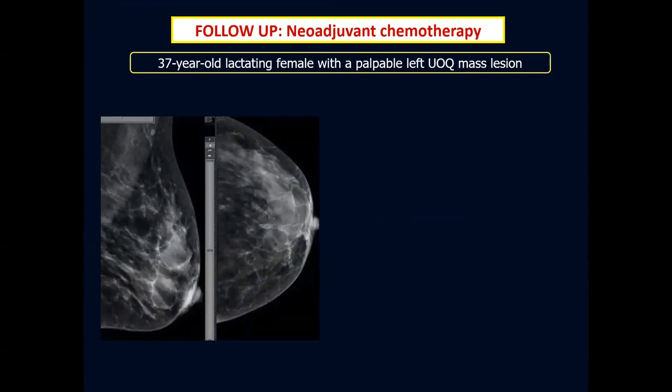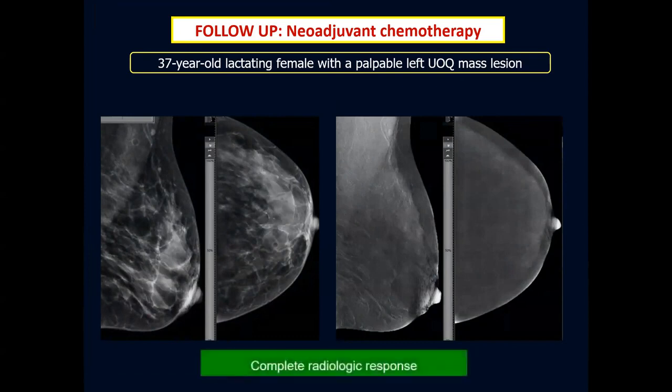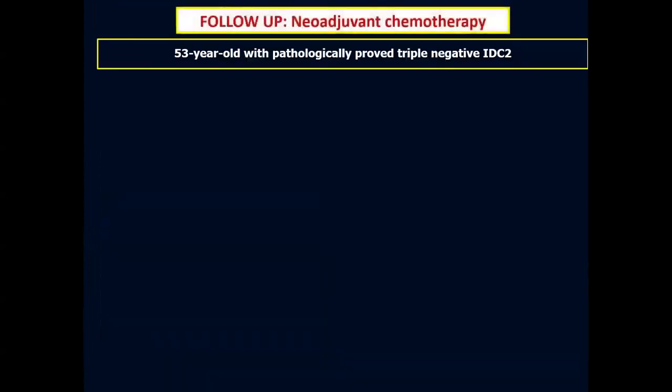This was her post-neoadjuvant films, and it is difficult to assess for the response in the post-neoadjuvant films, while with a single look on the contrast mammogram, we can surely say that there is complete radiological response.